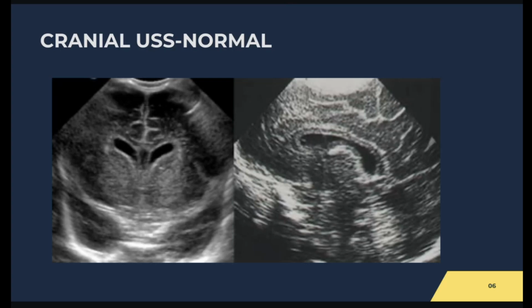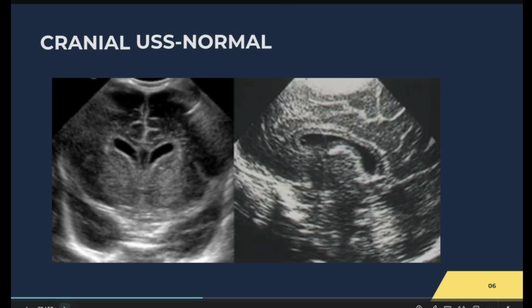Lateral ventricles. Yes, so this is something that we need to look out for in a cranial ultrasound scan, especially in a patient who has suspected hydrocephalus.